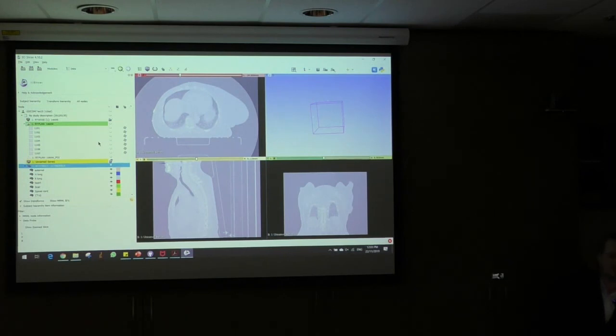Yeah. So it is useful in some aspects, especially when, for instance, you're looking at the mandible with the cheekbone. There's a little bit of a difference there. So you can separate them and even put them together if you wanted to. And you would put them together if you wanted to, for instance, 3D print that component as one piece.